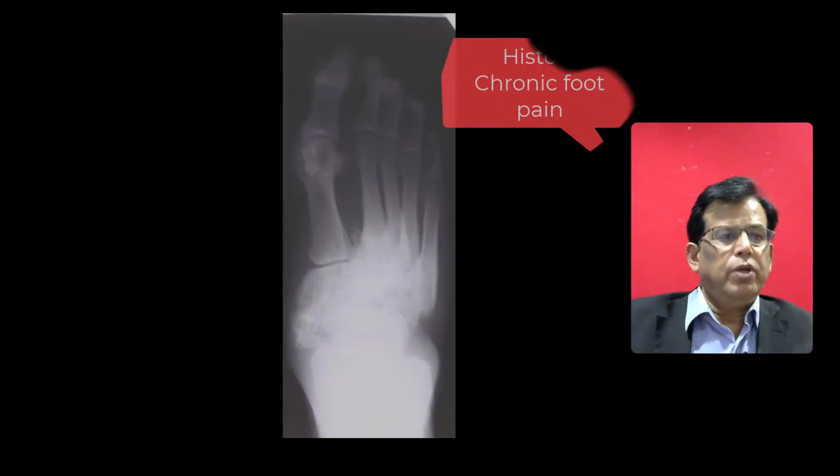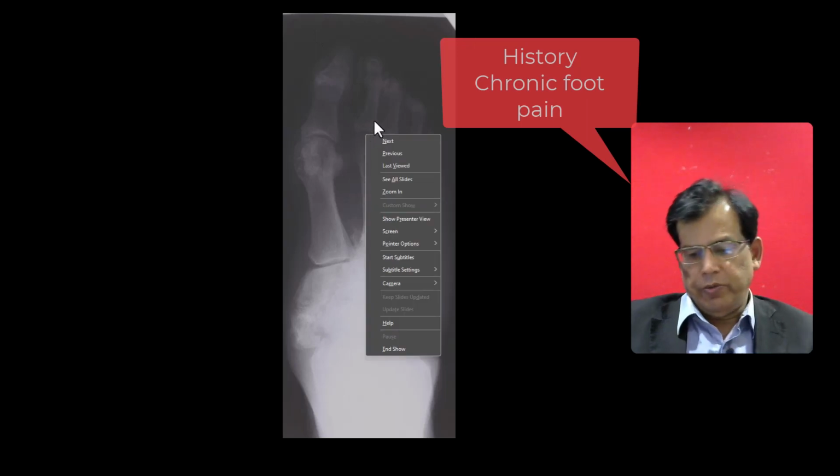So this is a radiograph, a patient with chronic foot pain.